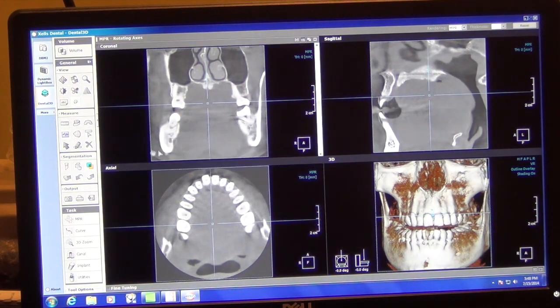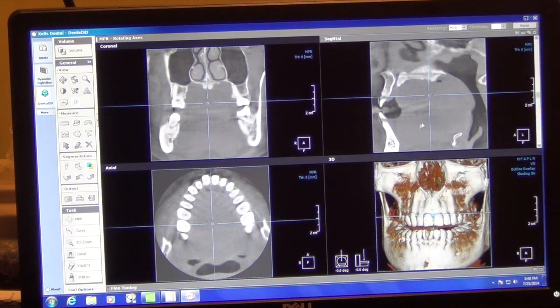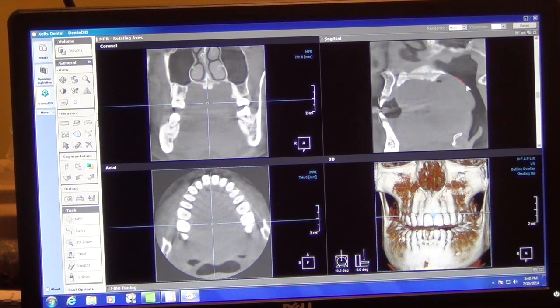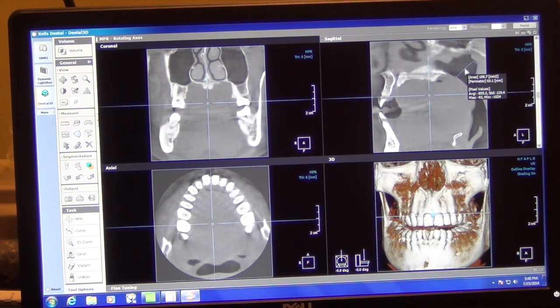So I'm going to reset, going back to our standard view. We can do measurements of area. So if we have an airway that we want to measure an amount of the area in a specific airway, double click, and it will give me the area and other values, an average value of the grayscale values in that as well. Now, does that show 3D or just within that cut? It should be just within that specific cut right there.